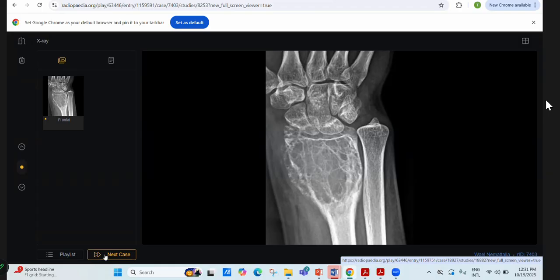I'm looking for the presence of any pathological fracture in it. I could not find any, but in my routine practice I will also check the orthogonal view for confirmation, and any soft tissue component and periosteal reaction. On this film, my differentials are GCT, or, as the epiphyses are fused, aneurysmal bone cyst is less likely. GCT is my top differential in this case. Further, I will compare with previous and proceed to evaluation with MR to further characterize this.